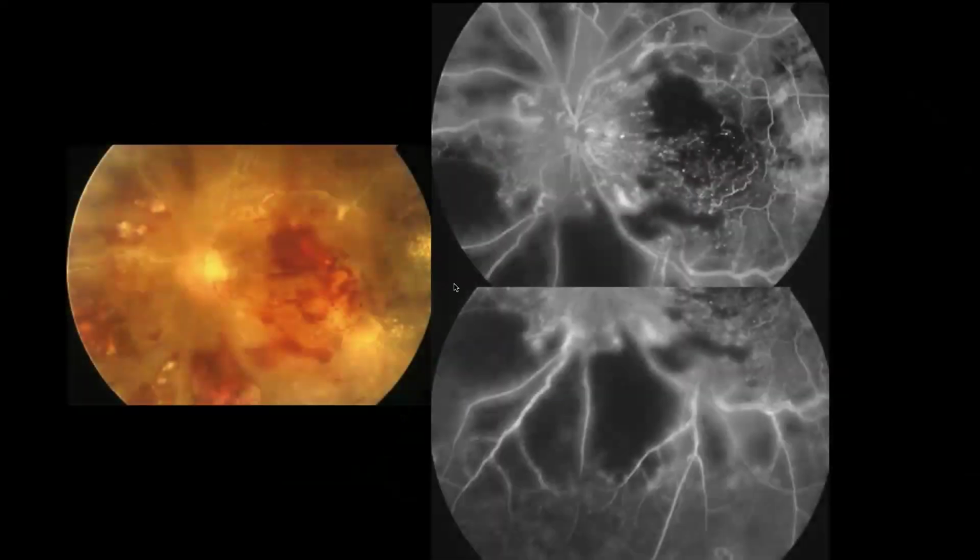Okay, so let's end by just doing two exercises. Sorry, hindi pa kita kilala eh, katabi ni Barbs. Steven. Sige, Steven. Ito kasi. Sige. So first describe the photo and then tell us what you see on FA.